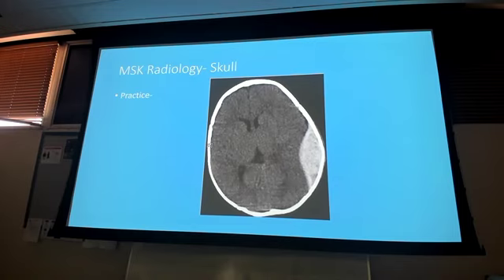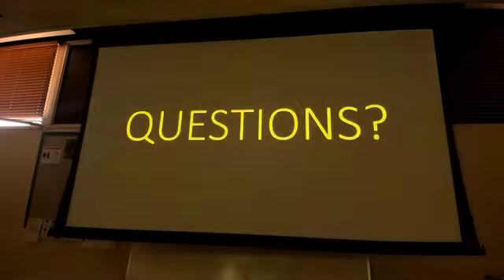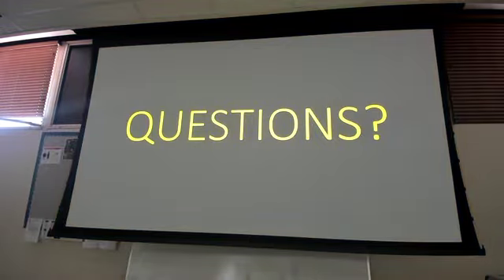What kind is this one? Epidural, little football. Questions on head bleeds or facial bones? Give me 30 seconds.